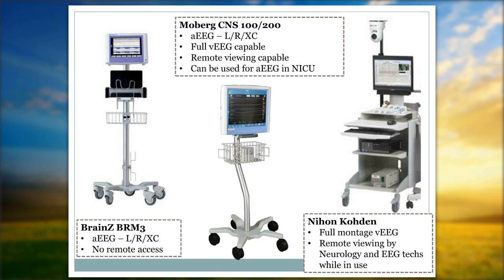Then second, we have the Moberg CNS device. We have a couple different varieties of them. We have a CNS 100 and a CNS 200, but these also are aEEG devices, and they show the left side, the right side, and the cross-cerebral, or the biparietal, however you want to call it. These are capable of full video EEG. They are capable of remote viewing, and we can actually use them for EEG or video EEG in the nursery.